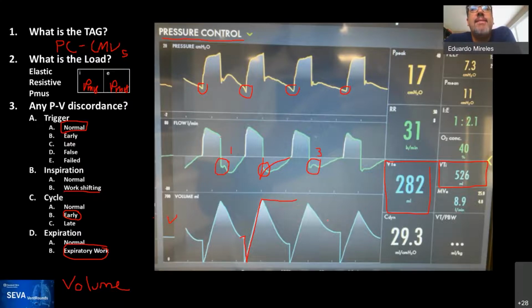The other one, and we had recently a patient in which they had a massive leak whenever the inspiration went in, but the area that we were focusing on was maintaining PEEP on that patient, maintaining recruitment. And so in reality, during inspiration, the patient could leak as much as they.